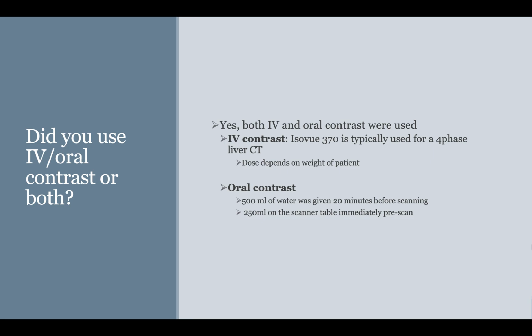So did you use IV, oral contrast, or both? Yes, both IV and oral contrast were used. For IV contrast, what we used was Isovue 370, and that's typically used for a 4-phase liver CT. The dose of the contrast depends on the weight of the patient.